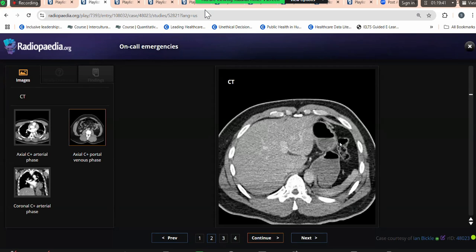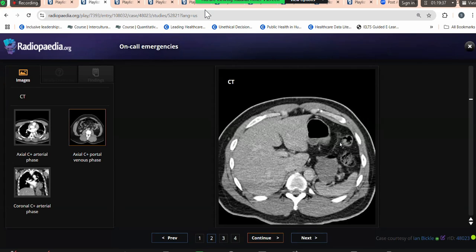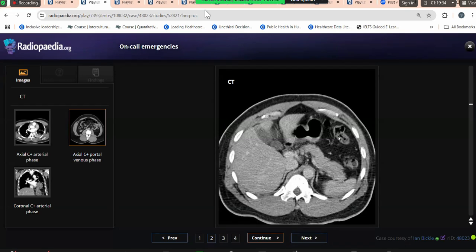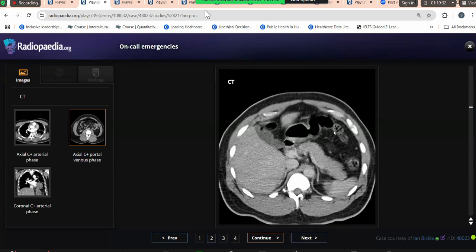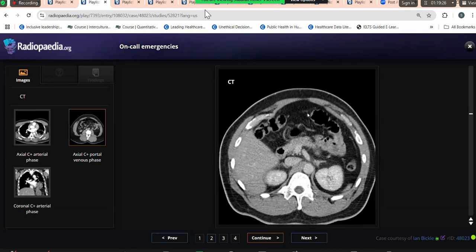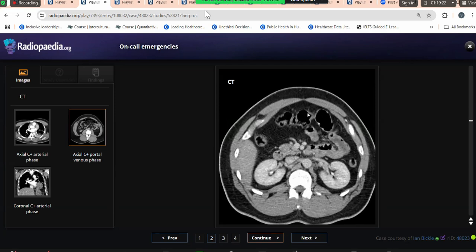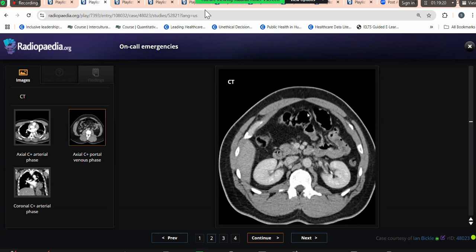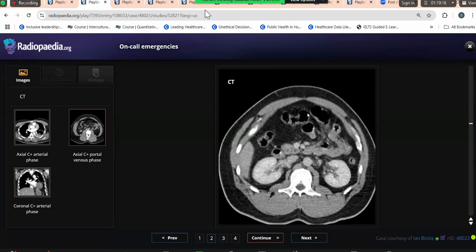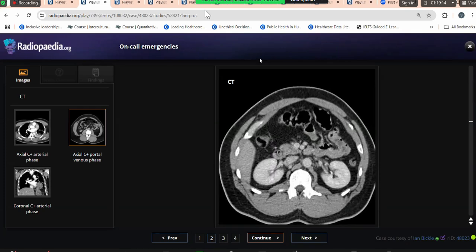Here. So I think I can appreciate the colon separately. So whatever you're looking at in the chest, can this be the transverse colon or the splenic flexure? No, ma'am, because I have traced it completely separately. Okay, that's fine. I'll give you the next case. Just leave the mouse. Yes, ma'am.